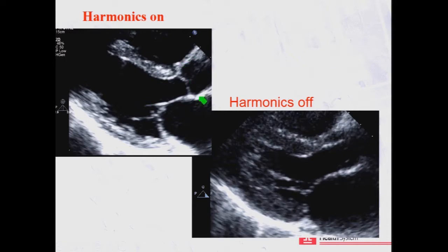That's because the authors, Stephen Goldstein, first author who wrote the thoracic aortic imaging document, noted that all of the recommendations for comparing echo to CT, for when to operate, the measurements historically have been made leading edge to leading edge, and so they recommend that on 2D, the aortic root measurements still be done that way.